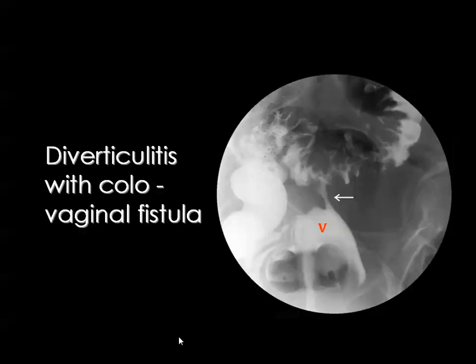Also, diverticulitis may result in fistulous communication, commonly with the urinary bladder, and less commonly with other pelvic organs and even with the skin. And here is an example of diverticulitis with fistula tract connecting the colon to the vagina.